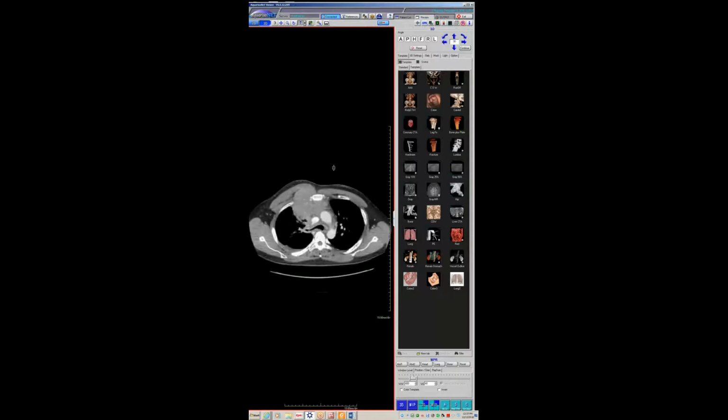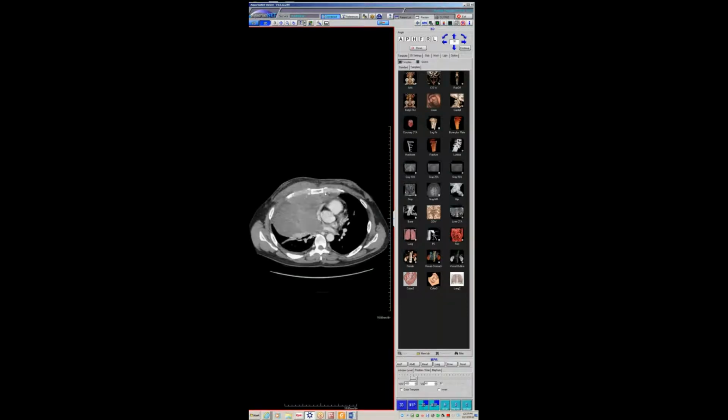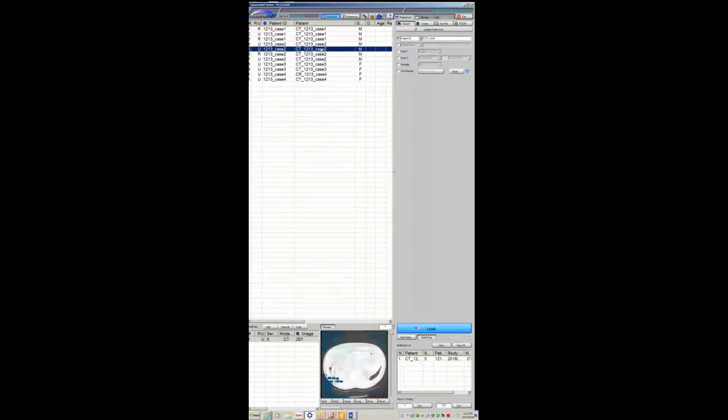So this is a person with a bad lymphoma, which is itself kind of interesting because it's invading the pulmonary vein and extending through the pulmonary vein, going into the left atrium. He gets it treated and it completely melts away, which is obviously good for him. Let me just pull these up in order. So lo and behold, the thing melts away, which is very nice.